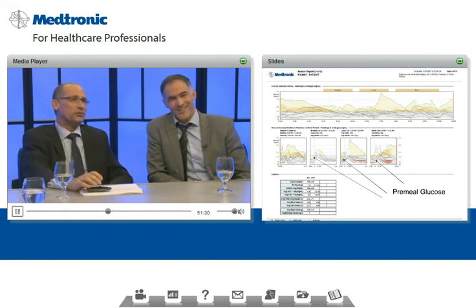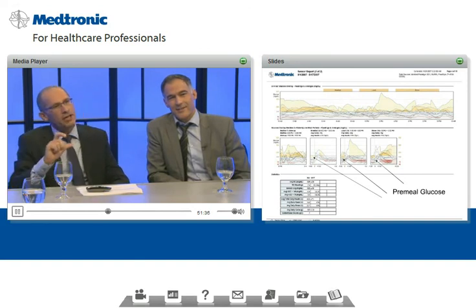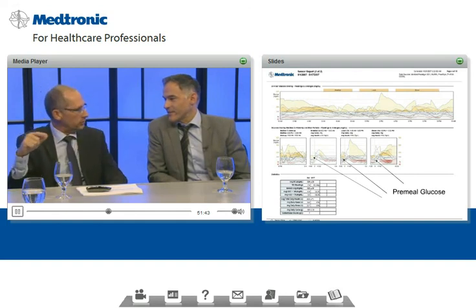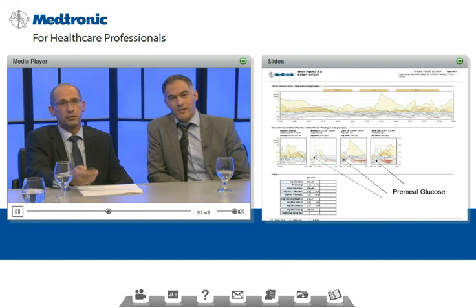Right. And fortunately for us, we see that in the last new CareLink 3 reports, there is already some work in progress to help us differentiate the active insulin and the basal insulin further on. All right. Okay, so this is the daily overlay, or the overlay picture where you get the graphic representation of the blood glucose and the meal information.